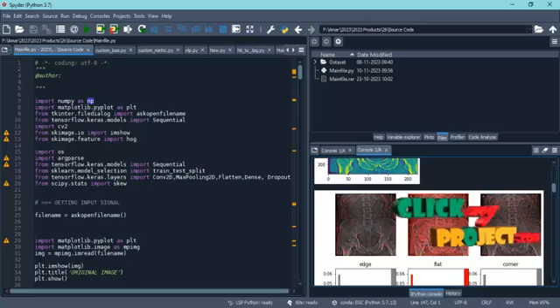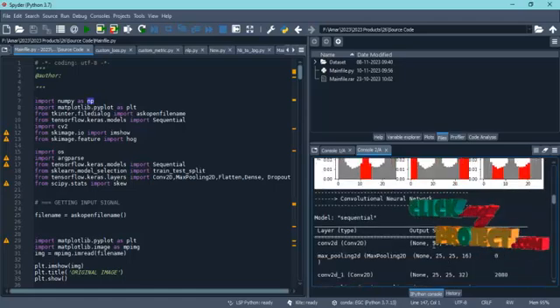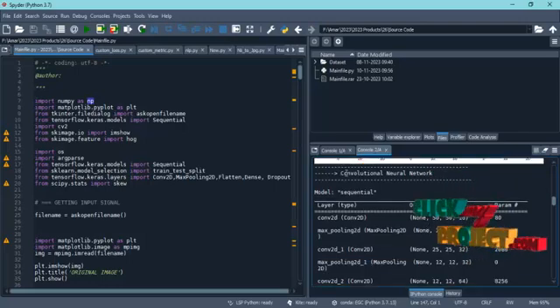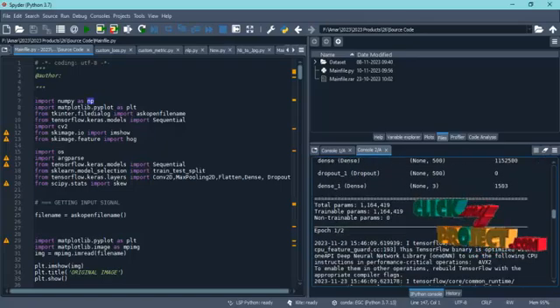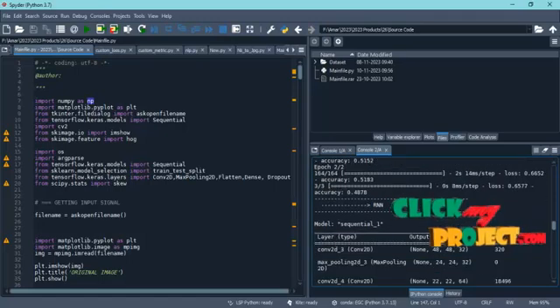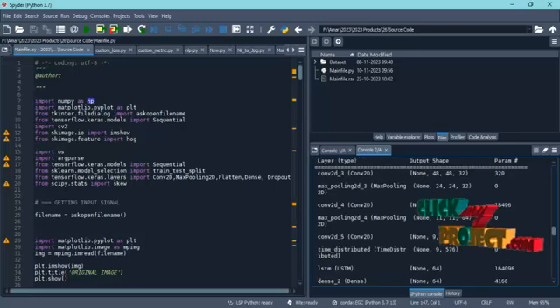Now after this, the local binary pattern will be extracted. This is the image which shows the local binary pattern. After extracting the local binary pattern, the image will be trained for all the images by using the local binary pattern. Now the convolutional neural network is applied here. These are the results belonging to the convolutional neural network. So the network layer is shown here. After doing the network layer estimations, the RNN is applied here. These are the results belonging to the RNN.